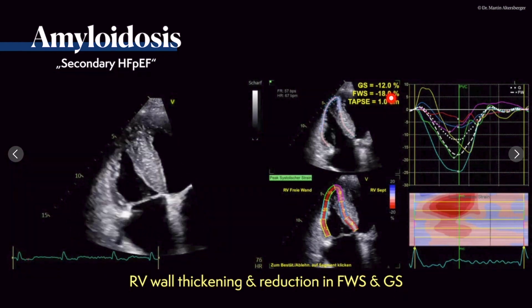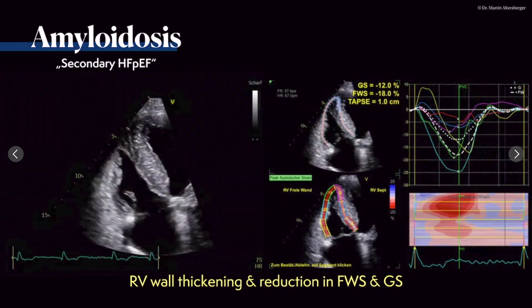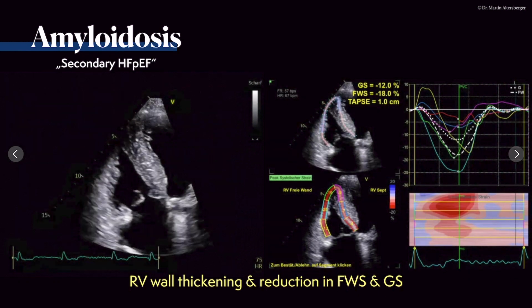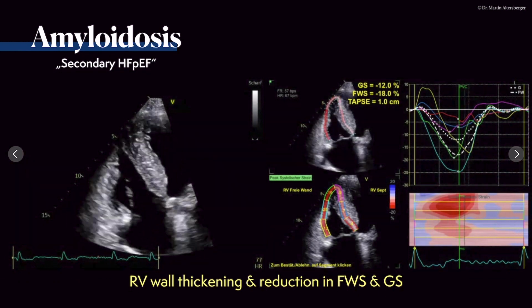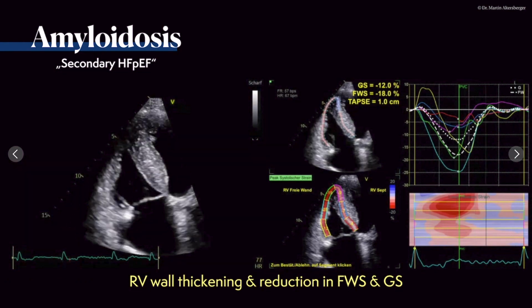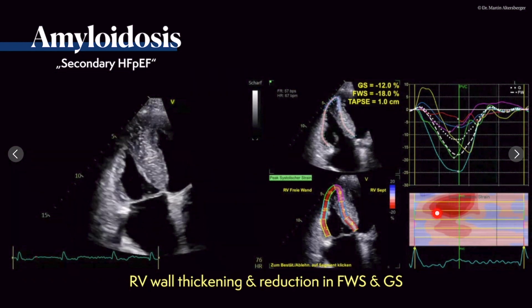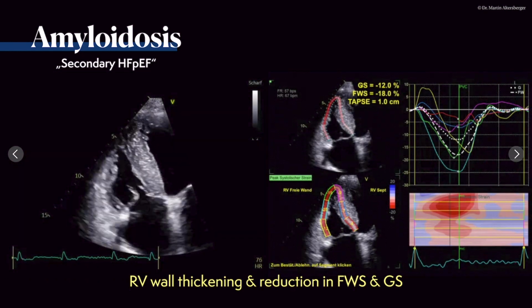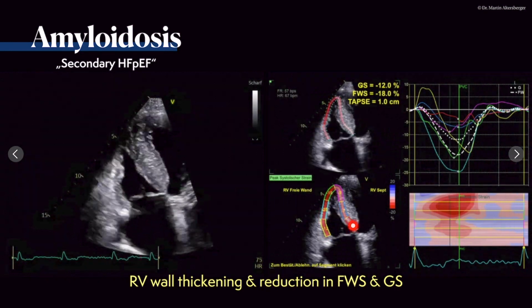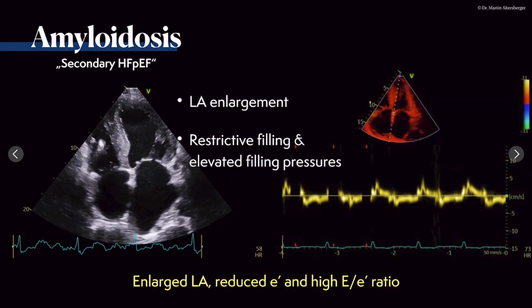Here, take a look at the free wall strain. It's -18 only, so the normal value, as I said previously, is -23. Also, the TAPSE is reduced, maybe not as reduced as it is written here, but still it's definitely reduced. We do see here the individual values of the segments, and the free wall strain includes those 3 segments. This is the color M-mode again. We still see that the right ventricular free wall has overall better values compared to the segments we included of the left ventricle. What else can we evaluate in amyloid heart disease?